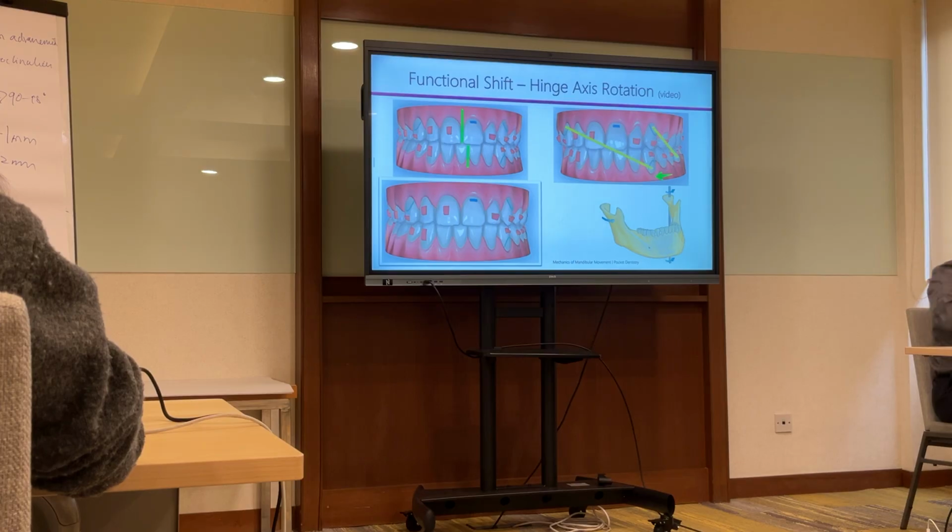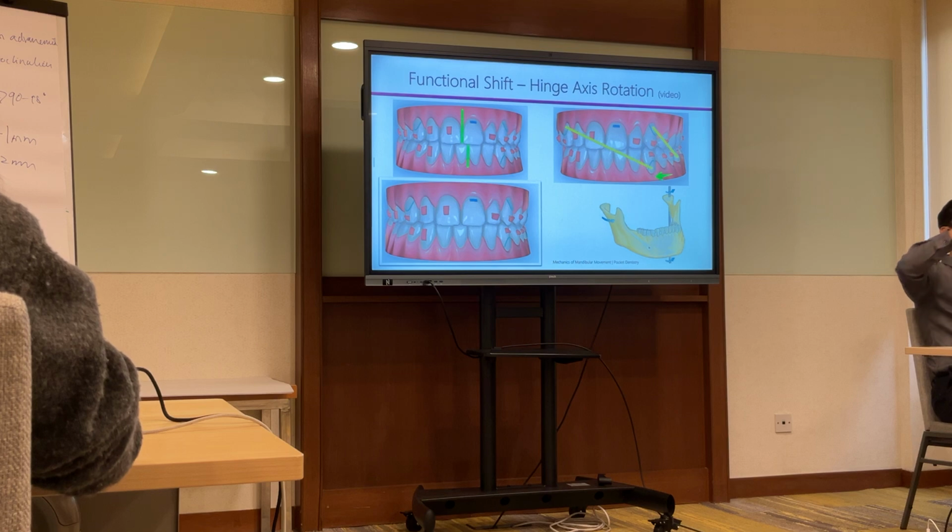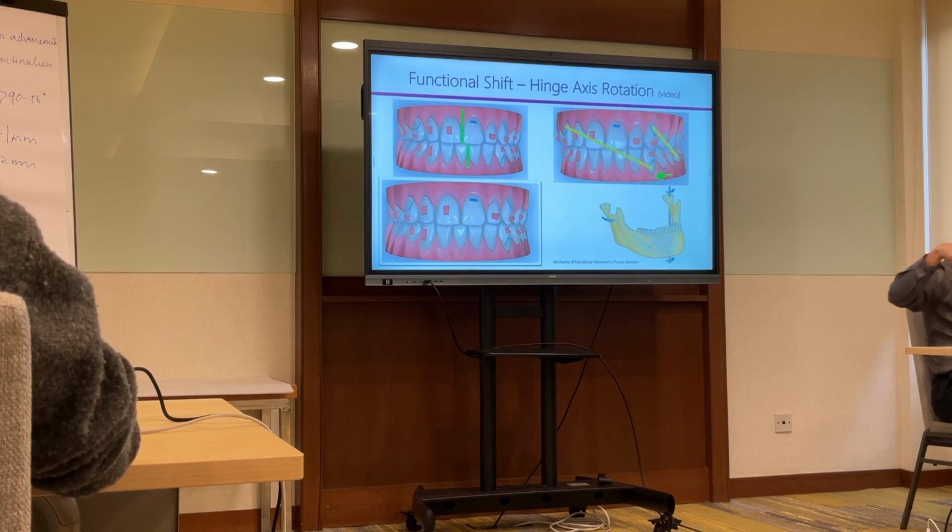That's what they add in the aligners setup, showing you that the midlines are getting corrected now because of the function. Setup typically shows you teeth getting straightened, and at the end, the word that they use is called a jump. Jump is, in one stage, you will see the entire mandible just move.